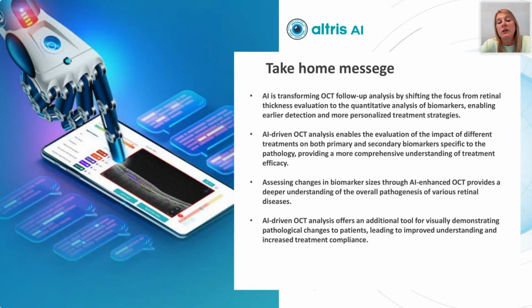And the take-home message today is that AI is transforming OCT follow-up analysis by shifting the focus from retinal thickness evaluation, as we used to do before, to quantitative analysis of biomarkers, enabling early detection and more personalized treatment strategies. So basically, we can track one pathology after another. We can evaluate the efficacy of treatment. We can evaluate how primary and secondary biomarkers are affected by the treatment.